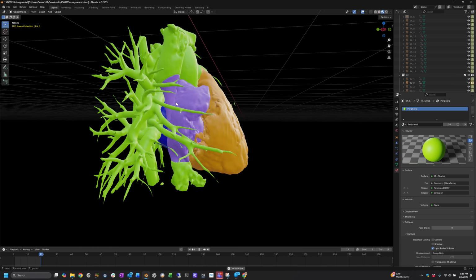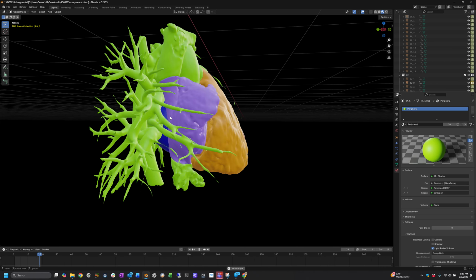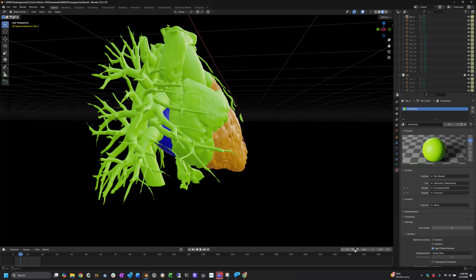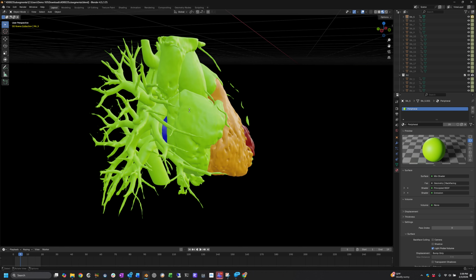Seeing how there's variability here, I think learning where that cutoff is. So if we pause here, this is the SVC. Oh, did I just land on one that? Yeah, so for some reason, 5. Oh, well, this is something. I think there was one where the right atrium did not turn out well and did not segment well, and so that's probably why this one is like that.